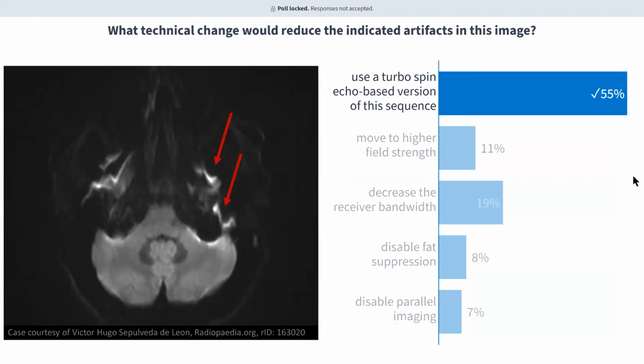It's very difficult to see sometimes on conventional DWI because conventional DWI is obtained with an echoplanar imaging technique, which is optimized for the brain, but at the skull base, because of the rapid shifts in susceptibility, there is creation of eddy currents, which causes geometric distortions and piling up of signal and signal loss in other places.